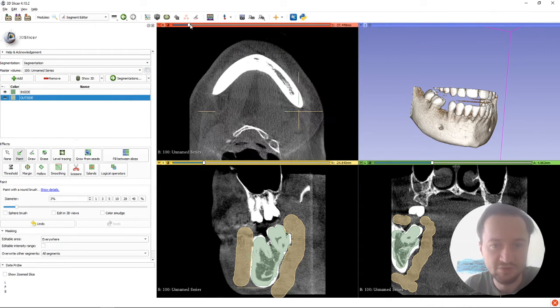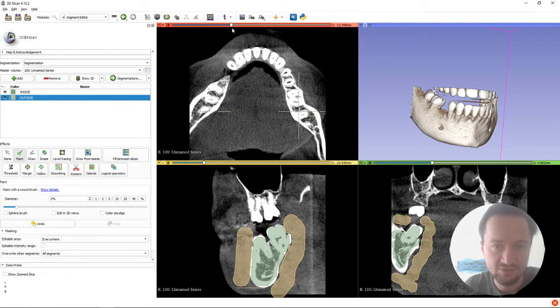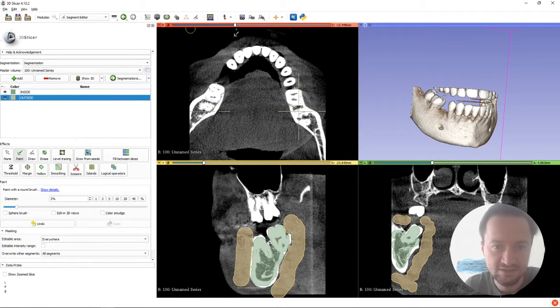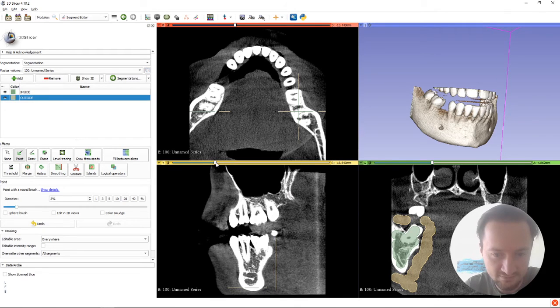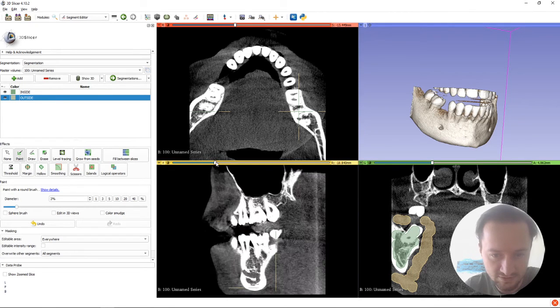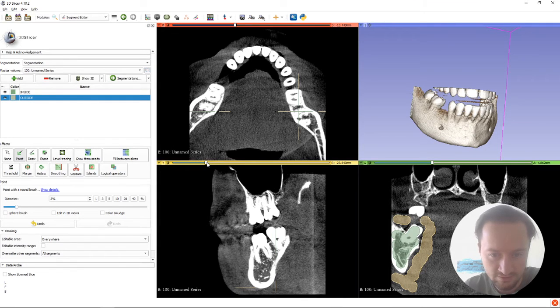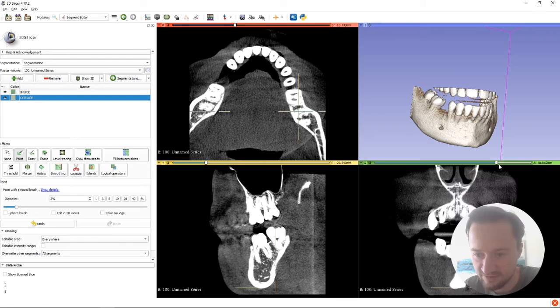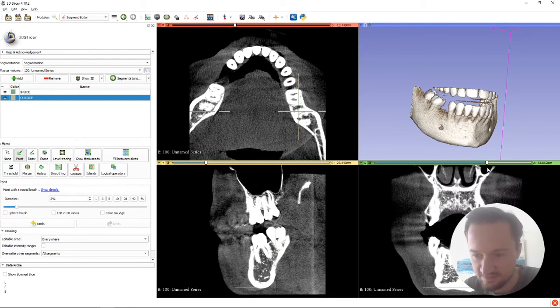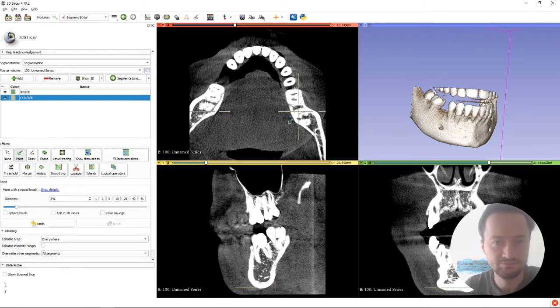Now what we're going to do is just push the slices up a little bit further, and here I'm going to do it where I can start to see the teeth. Same here, I'll push this up more or less. Closer, let's go for those teeth there. And then again, we'll push this slightly further. And this time I want to see the teeth on that bottom jaw.